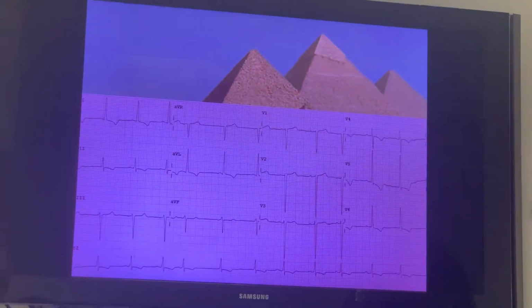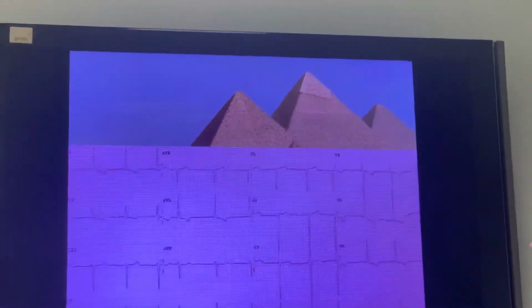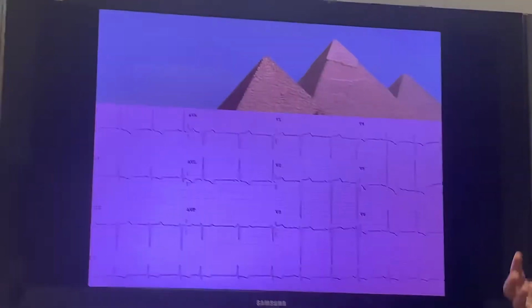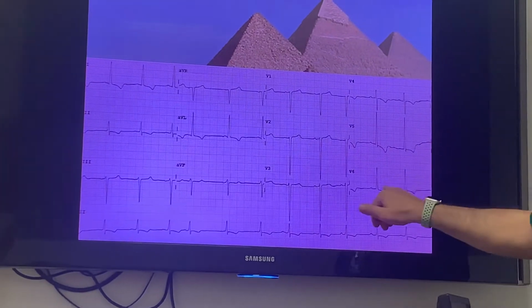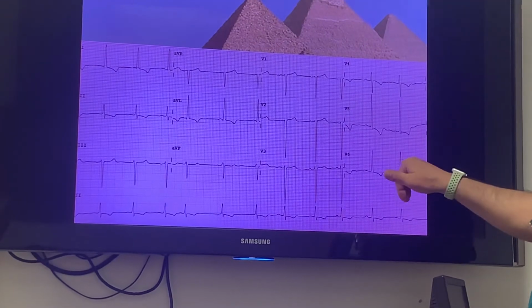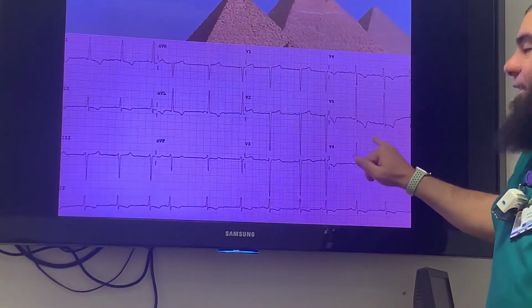So another cause of ST depression could be the left ventricular strain pattern, and usually a patient with hypertension is going to compensate the overload or the load after the heart, and they try to hypertrophy or try to compensate that. Initially he will be in strain because he's pushing against resistance, and what we get is ST depression with T-wave inversion. But the characteristic here to differentiate it is in lateral leads. Usually you are looking to lateral leads about the strain pattern. So lead 1, aVL, and V5 and V6.